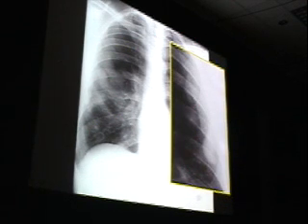And as one breathes, it scratches on the parietal pleura. So that's where these things are actually occurring. And they're in the periphery of the lungs, in the mid and lower lung zone. So this would be sort of the next most common. It's not quite as classic as the calcifications that we talked about, but it's certainly more suggestive than a small pleural effusion.